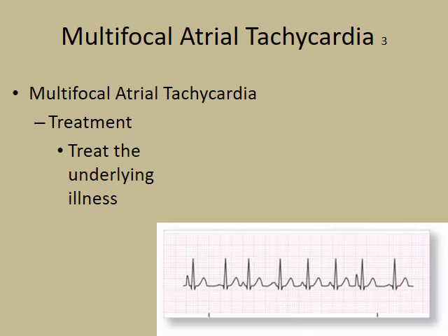Since Matt is sick, we need to figure out that underlying illness. Look at these crazy P's here, and we're at a fast rate. Matt is sick. Figure out that underlying illness.